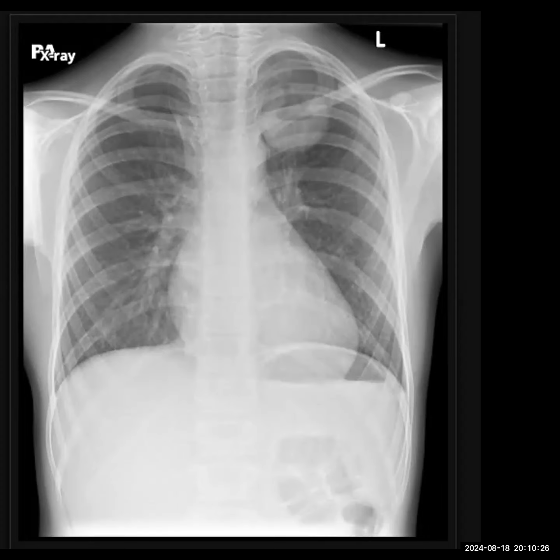If the patient is having any history of sepsis, then septic emboli is possible. However, that would be more peripheral and bilateral. Which lobe do you think septic emboli would present in? Lower lobes. So do you think this could be septic emboli? No. Okay, so unlikely.